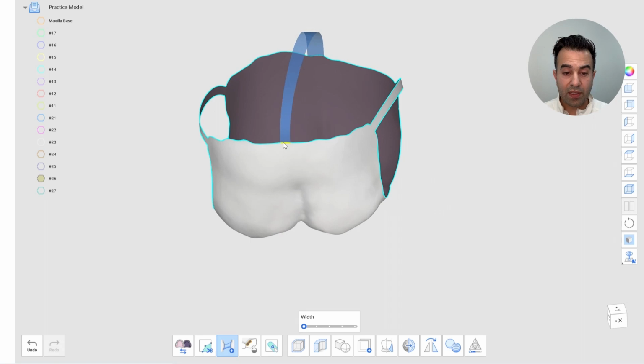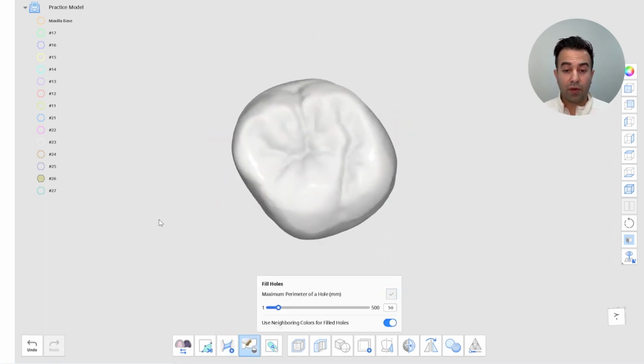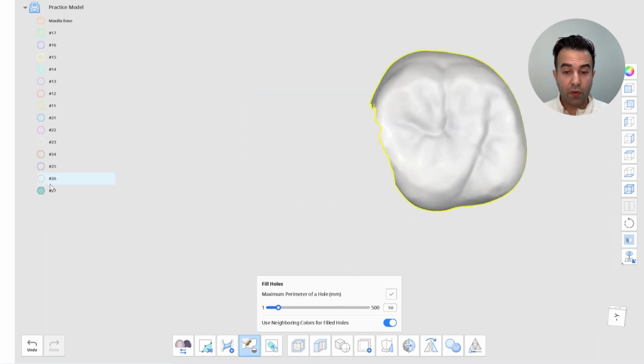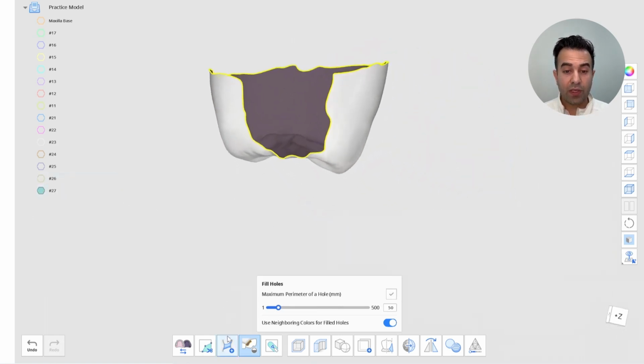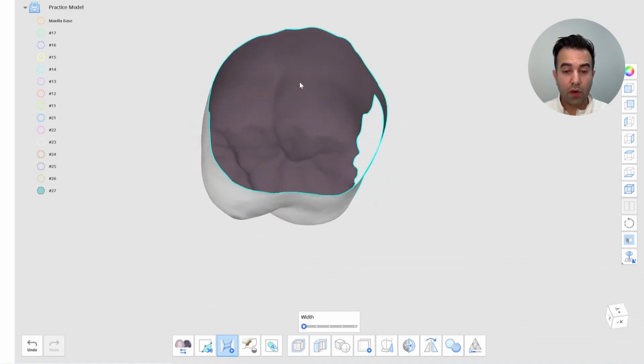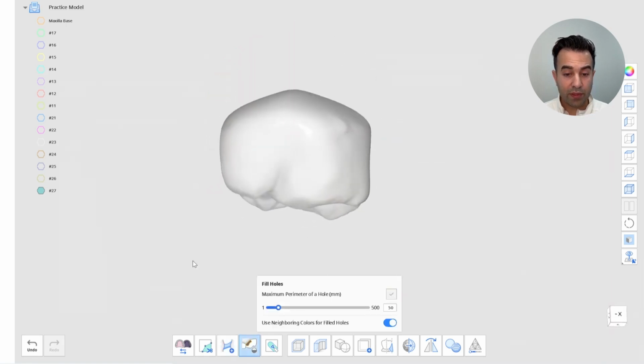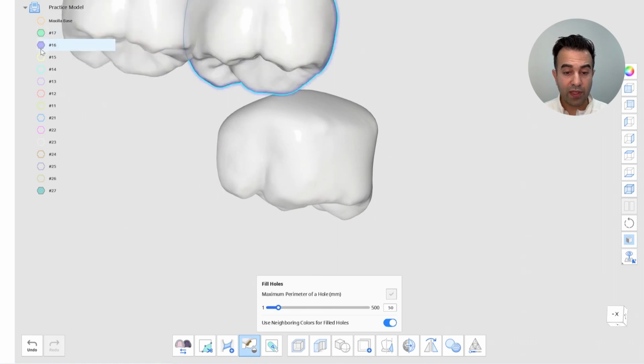And the advantage of these teeth, they are technically 28 Pontics, so you can use them for immediate dentures, for a complete denture. You can use them for designing and planning the all-on-X cases. You can use them for a digital mock-up for composite veneers or for porcelain veneers.